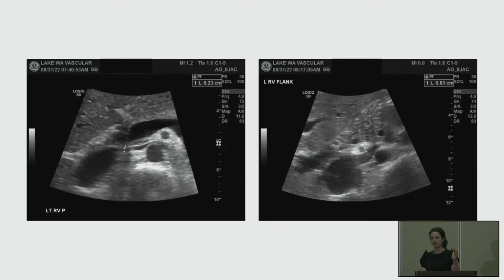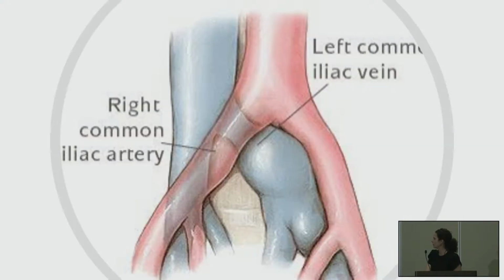So check that, because if it's refluxing into the gonadal vein, tilting that patient or putting them on that side, it can go from retrograde to maybe a to-fro flow, or possibly, if it's severely compressed, into antegrade flow. So this is one of the things you'd want to double check to see: is it positional compression or is it fixed compression? And the times when it is a fixed compression, I'm noticing it to be more from the right renal artery rather than the SMA. So just something to keep in the back of your mind.